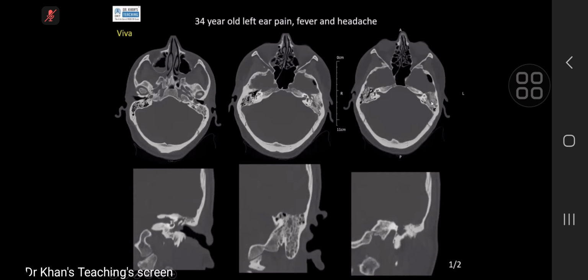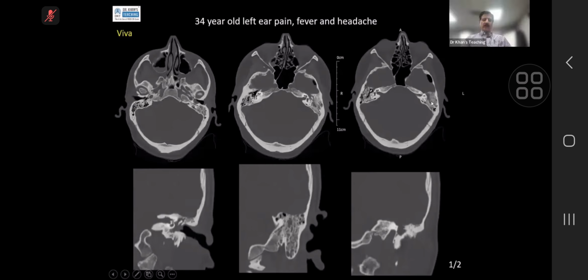I believe there is a bony erosion of the ossicular chain, because I can't see the ossicles now. I would like to take this further by having an MR done. Yeah. So now the key point here is, and it is a classical exam case.